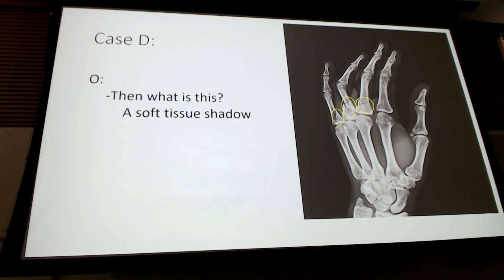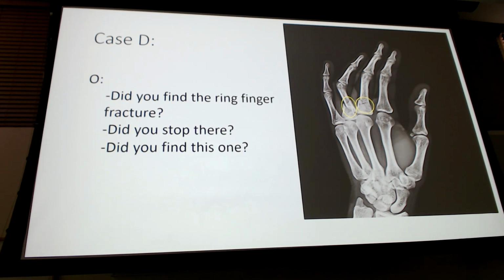So the first picture of it, it does have it going into the middle. But on the next one, it doesn't look like it. And so that's where, like here, that one doesn't look like it, it's just the soft tissue.